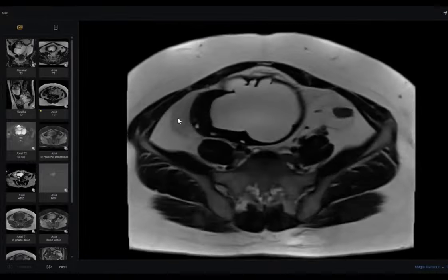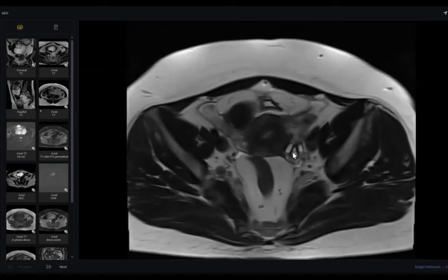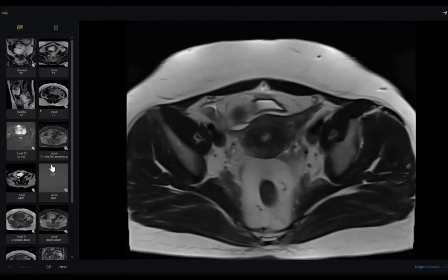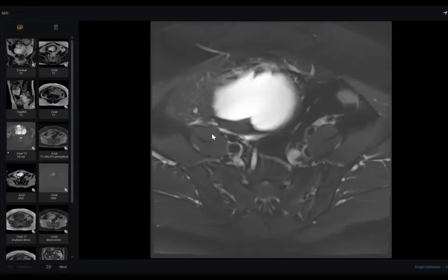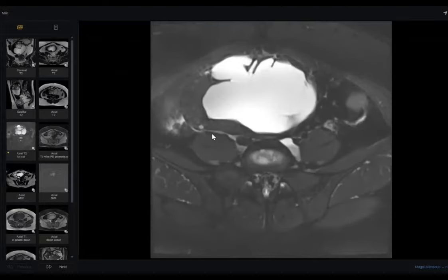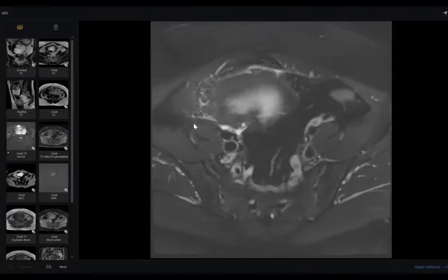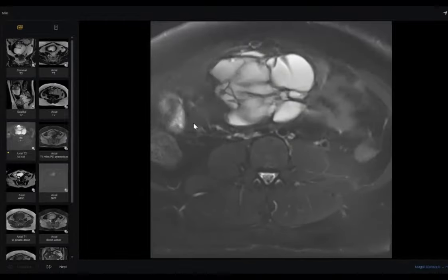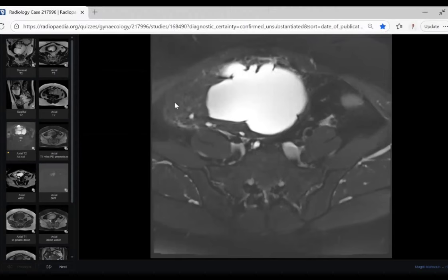Look here, this is the normal ovary, normal location, and normal shape. I told one of our candidates before, if you bring the STIR especially, you will see very severe edema. I can define it on STIR, very characteristic. There is some edema here, but in some types of torsion it's very marked edema. Anyway, try to connect the history with the signs that you are seeing.